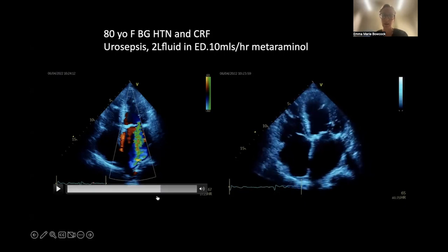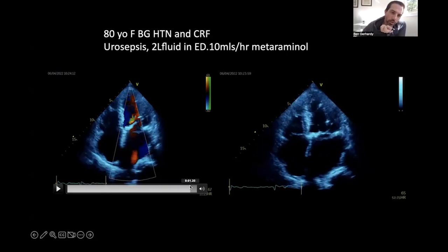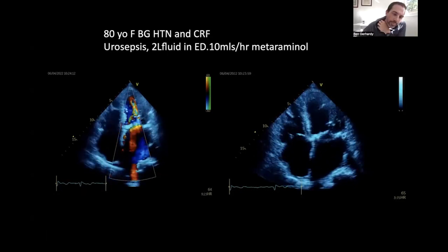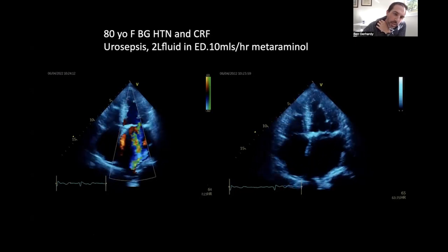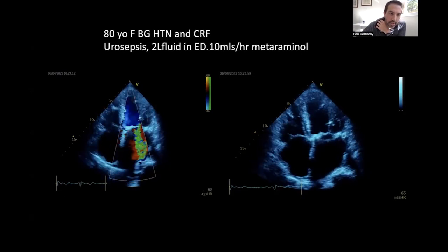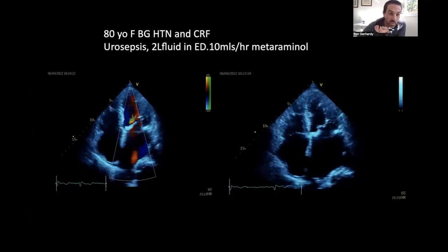These are all in keeping with what could be severe mitral regurgitation. And you might have picked up on something else that you can see just playing in this loop, Ben, another type of valve pathology that's coming through. So can you scroll back? Do you want me to just do that in real time? So it looks like she's going to have mixed mitral valve disease. It looks like there's some splay and potentially a small PISA in the left atrium during diastole. And then also there's a flash of green that I think is in systole, need to slow down, that's coming out of the left ventricular outflow tract, which may be some aortic valve stenosis, which I would expect in this woman, given her comorbidities.